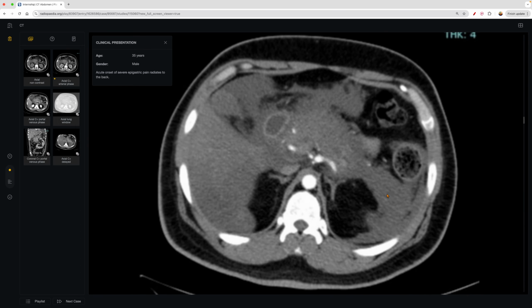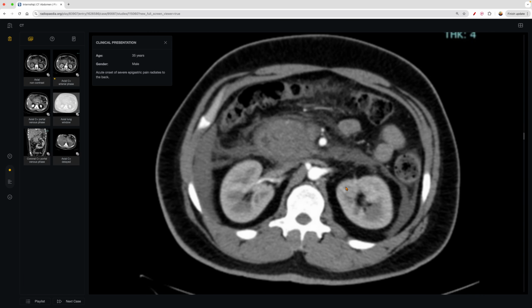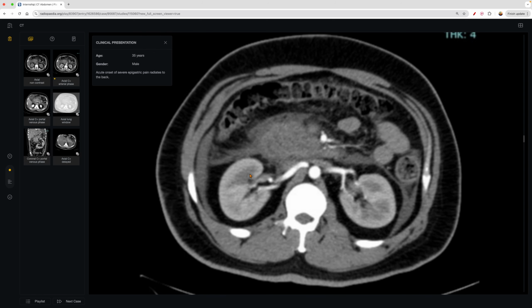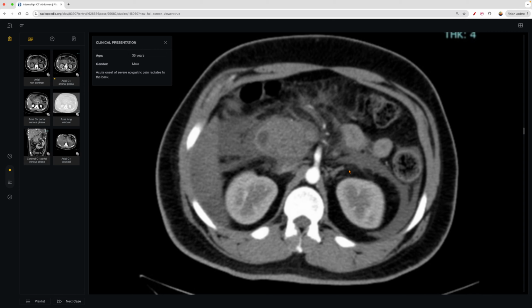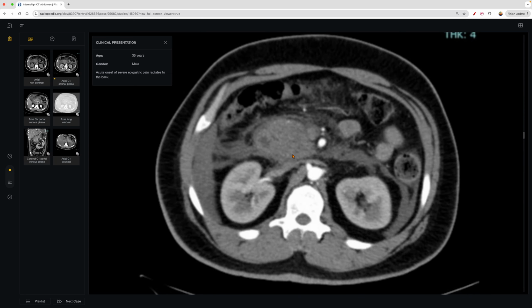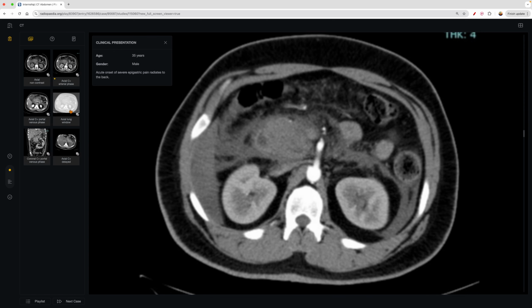And you'll notice here something might be striking to you, and this is something I found out later in my learning journey, that this fluid seems to be around the kidneys but not touching the kidneys, right? And that's because the kidneys have their own space, the perirenal space. So they have their own space, just like there's a posterior peritoneum and other retroperitoneum, I should say, and other cavities within the abdomen. The kidneys have their own space as well, so they're somewhat shielded from this, which is, I suppose, nice. And it's just normal anatomy, knowing that they have their own space.